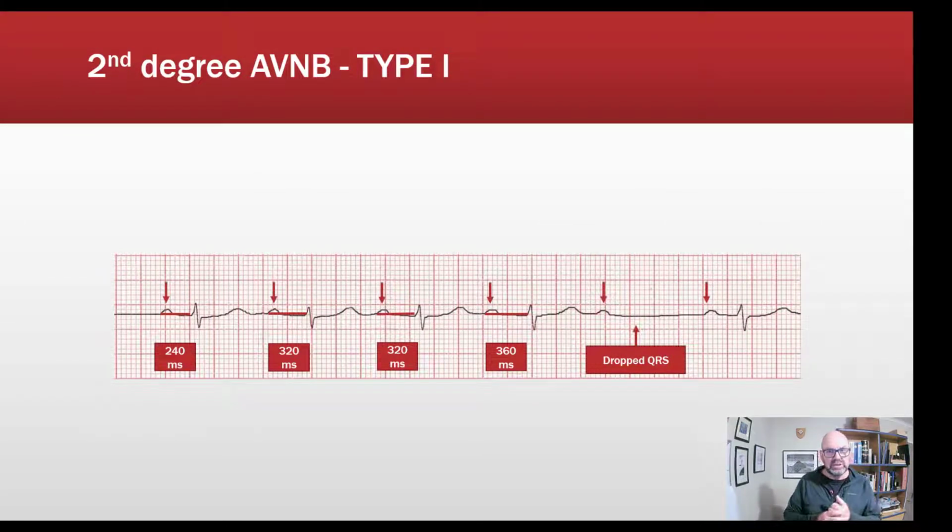The fundamentals to recognizing this rhythm are firstly a careful check on the regularity of the rhythm. And a very careful check of the R to R intervals on this rhythm is going to show that there's some degree of irregularity, although over a longer period of time, we're going to see a pattern repeat. Secondly, when we look at the P waves in this, we can be assured that in lead 2 they're positive, they're rounded, and therefore we can assume a sinus rhythm. I can recognize more P waves than there are QRSs. So now I know I'm definitely dealing with some sort of advanced heart block.